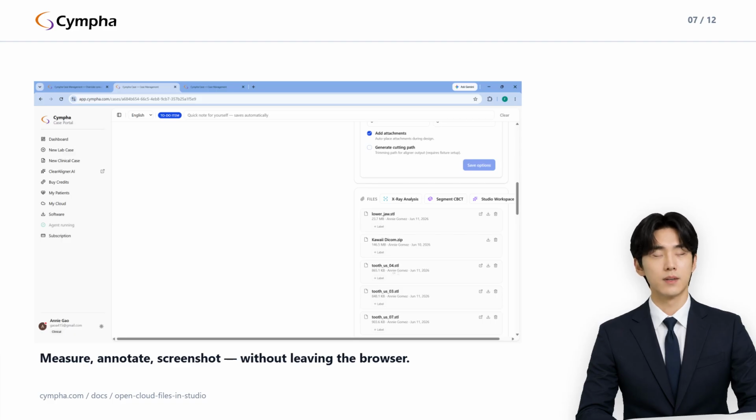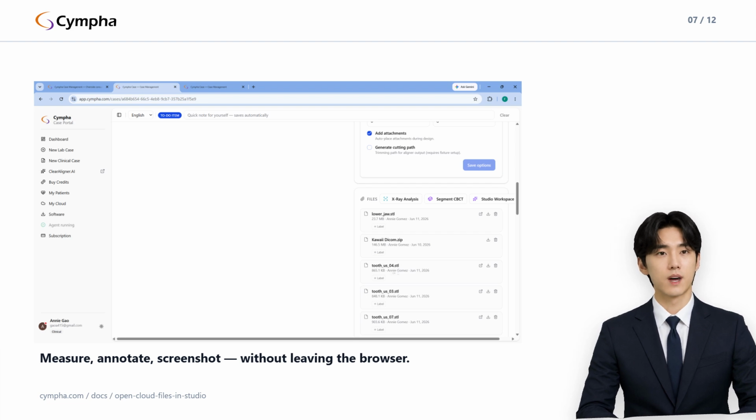Viewing never overwrites the original file, so if you did something worth keeping, you have 3 exits. Exit 1. Save the session as a fresh project bundle via Save Project As, in Studio's hamburger menu, then upload that CYP back into your cloud. It lands as a new file alongside the original.